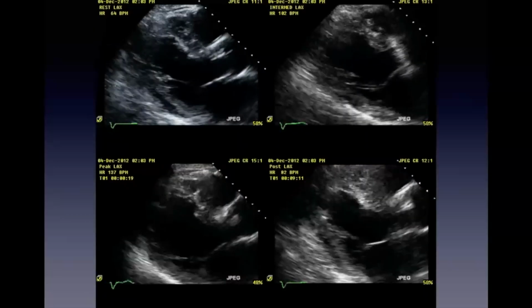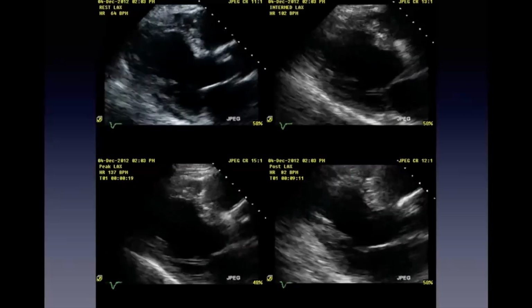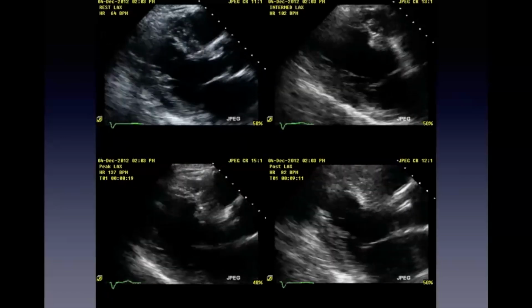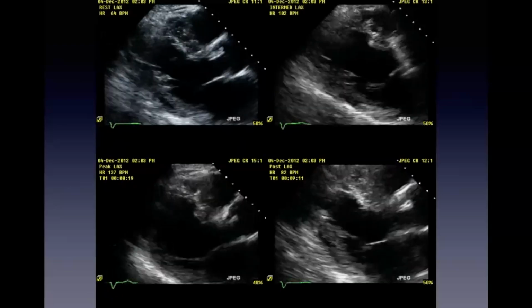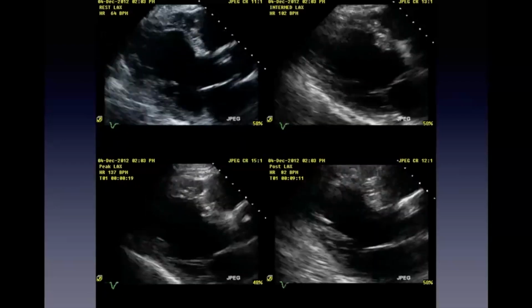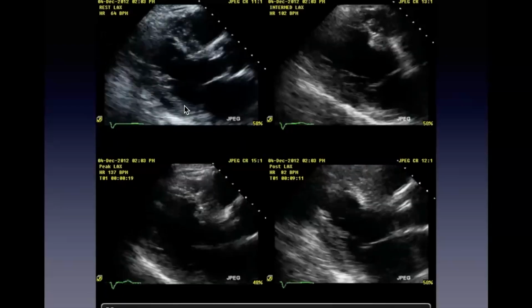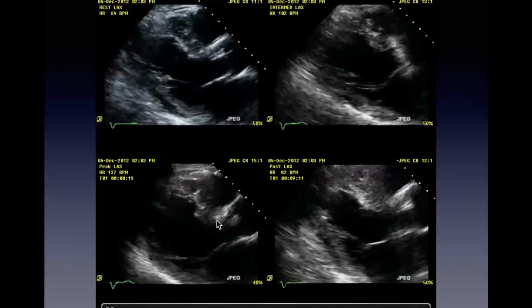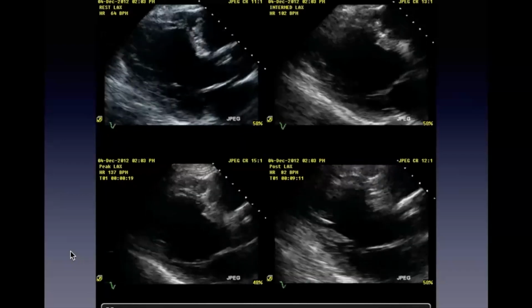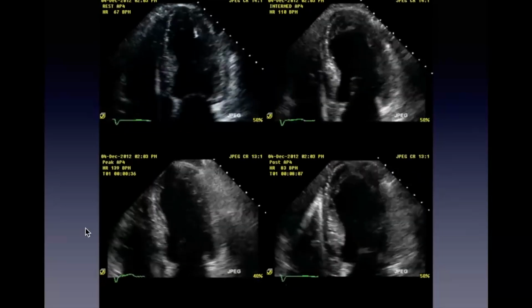Okay. So the patient had the stress echo, wasn't ordered by me, but here's the stress echo. I'm not sure if anybody wants to comment on the stress echo. Yeah, so I agree. So this is rest, intermediate stress, peak and post. The LV dilates and gets worse, right? So there's definitely a reduction in the LV systolic function, reduction in the LVEF on parasternal long axis. So compare here to here.